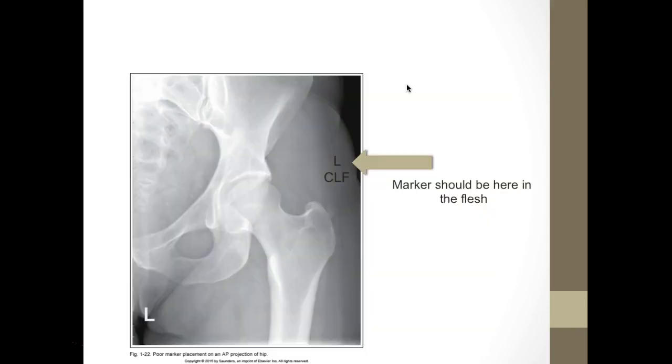Okay, so when you're shooting a hip, the best place, what you can do is you're going to fill in between. So from the greater trochanter to your ASIS, you're going to look in that groove. You can see there's a huge opening right here. This here is confusing. Is this a right marker or left marker? Did they mean to shoot the right hip, the left hip?